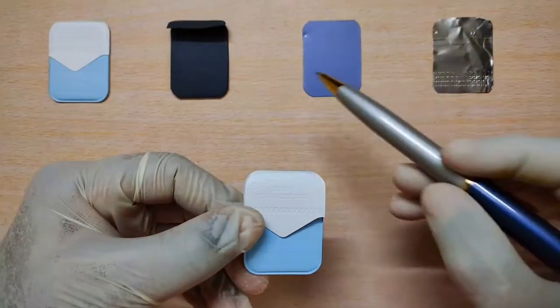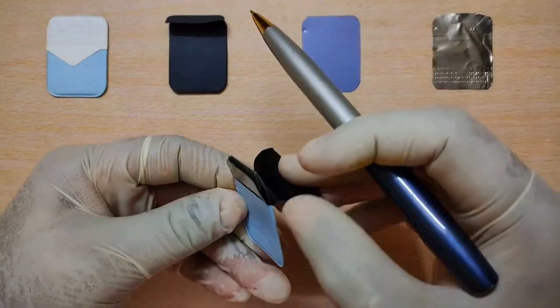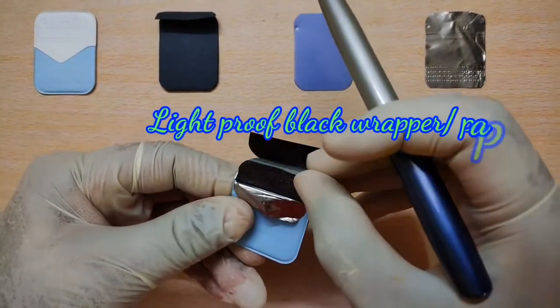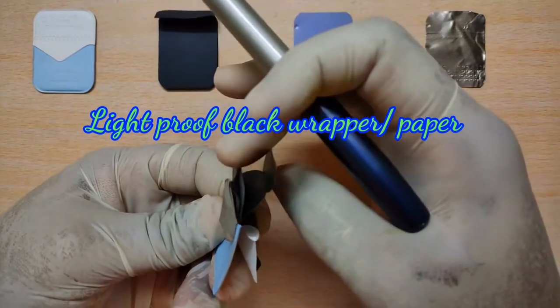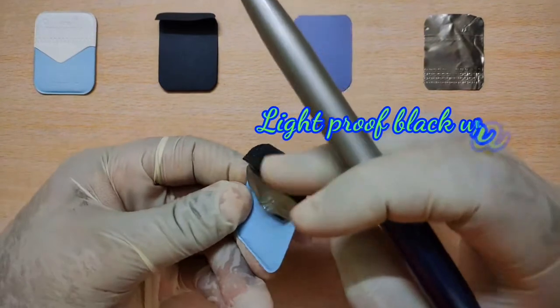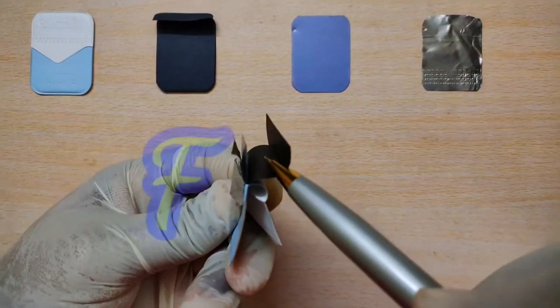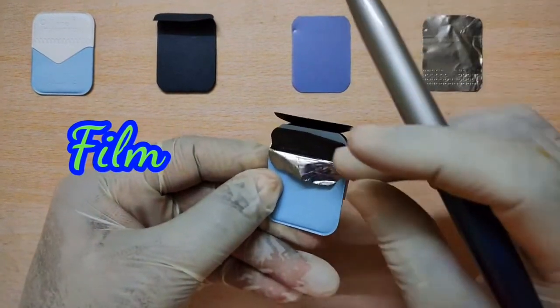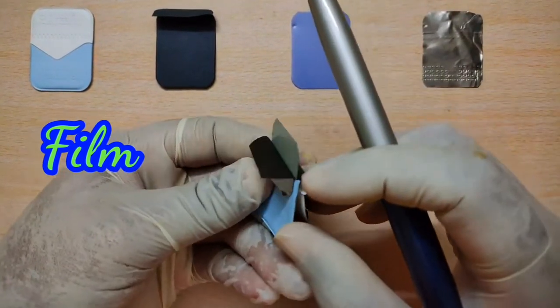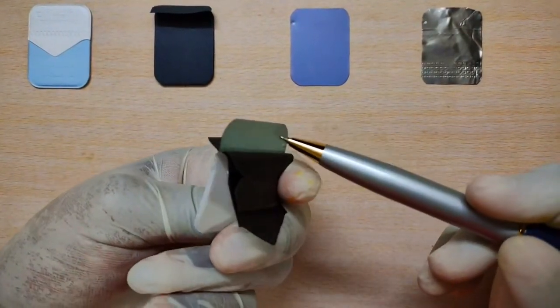Moving on to the second component of the film packet. Inside this outer plastic wrapper, there is a light proof protective black wrapper or paper on both sides which is wrapping the film. And this is used for preventing light exposure and also to prevent the emulsion on the film from physical damage. And the third component is the film itself, which is present inside the black wrapper, and it is the sensitive part that acts as the receptor, which has the base, adhesive layer and an emulsion in it.